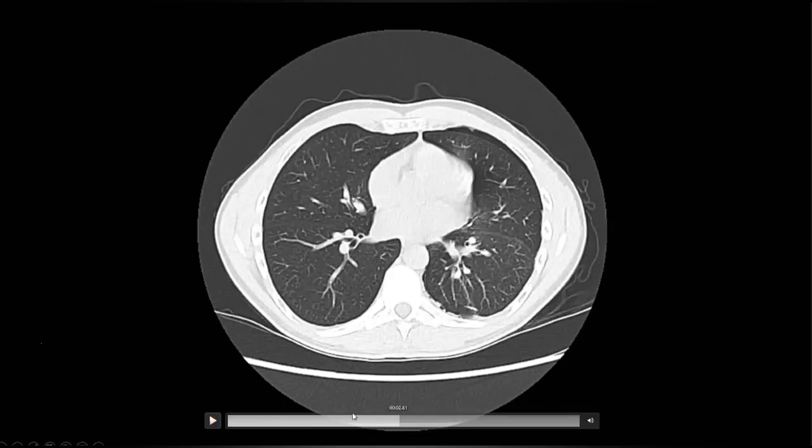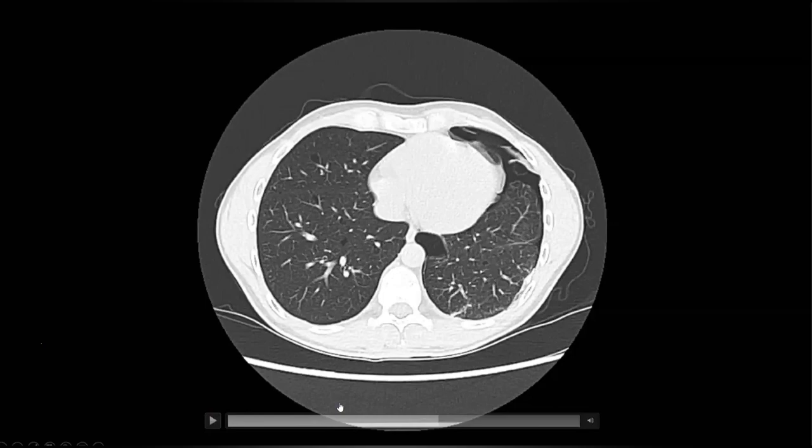Right. And what do you think over here? Quickly. Bilateral pneumothorax? No, that's not bilateral. There's no pneumothorax over here. What do you think about this? Small cysts, yes, bilateral. So there are multiple small cysts of bizarre shape. Right. And if I tell you that this patient also had some renal lesions and skin lesions, does any differential come? Tuberous sclerosis with cystic lung disease and left side pneumothorax.